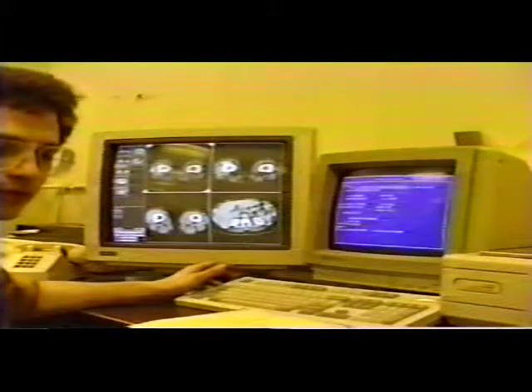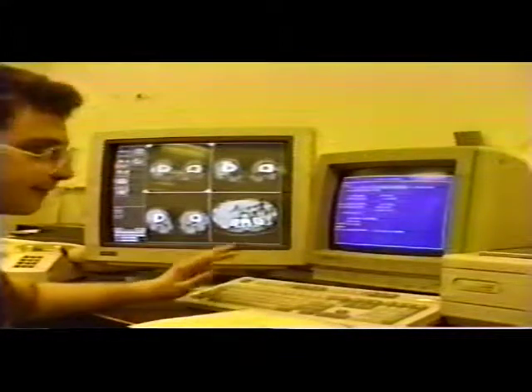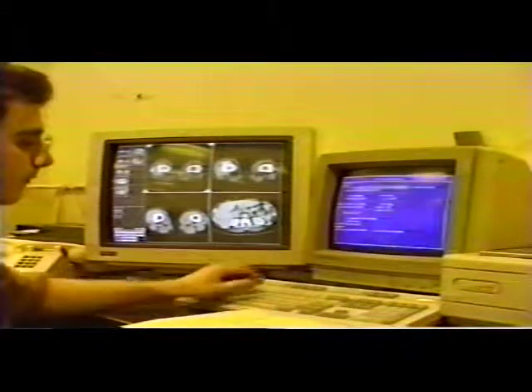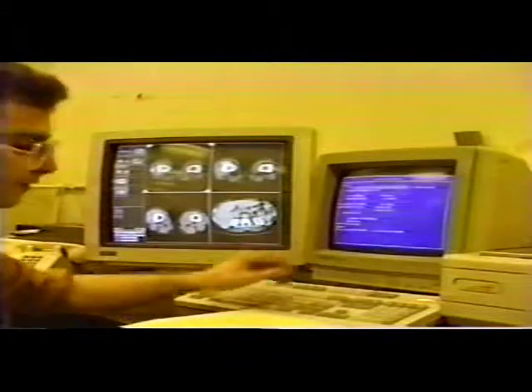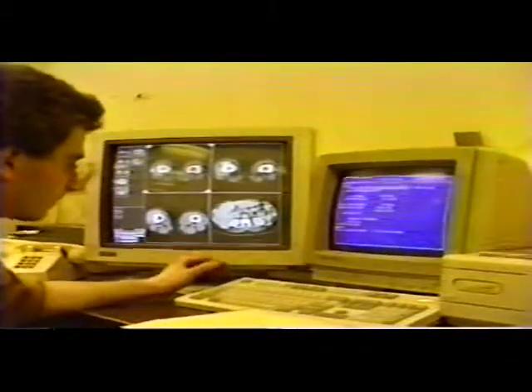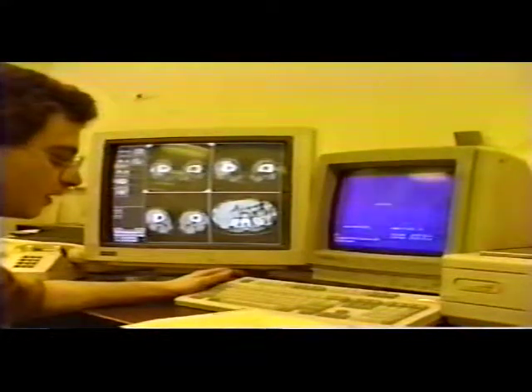There will be a password system where a nurse will insert their password. Also a provision to undo any edits to a field if you make a mistake. Most of these things can be exited just by pressing escape.